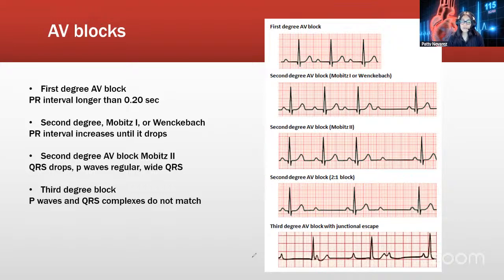Therefore, the ventricle, having the automaticity and the conductivity characteristics, fires on its own. So when we look at this strip, there is some order, even though at first sight we don't see it. So what we're going to go ahead and do is locate the R's.